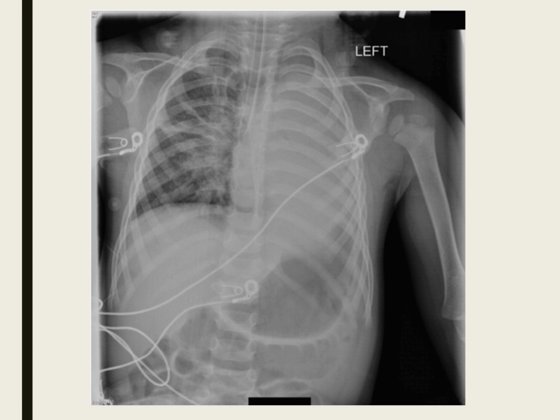E, everything else. Obviously the left hemithorax looks pretty abnormal. It's pretty whited out. So why is it whited out? Is this an effusion that's whitening it out? Could be. Okay, could be effusion. So what do you tell about effusion and mediastinal shift? Do you think there is mediastinal shift here? A little bit to the right. Yeah, it's to the left actually, right?